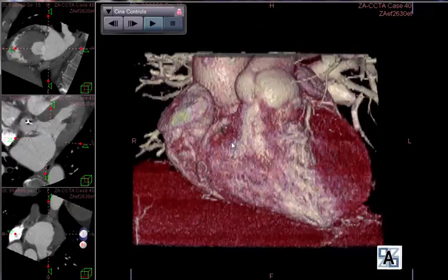So this patient has had a minimally invasive aortic valve replacement with a bioprosthesis that appears to be functioning normally, although is quite small, on the order of 20 to 22 millimeters. His overall cardiac function is normal, and his mitral valve function is likewise normal.